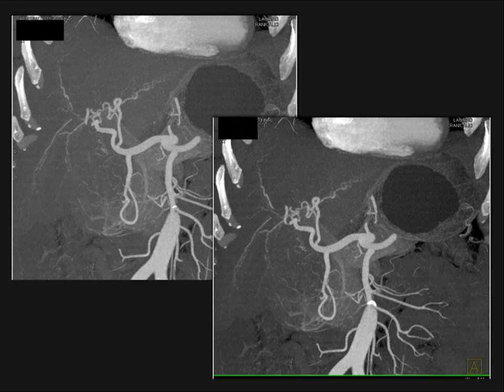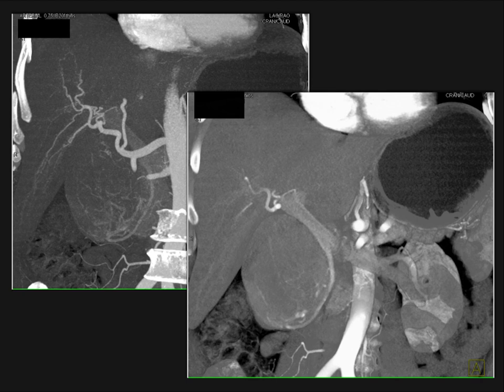And then you look at it a little bit closer, you say, well, it abuts the portal vein, but not invading the portal vein. And it abuts the SMV, but not invading the SMV. And we can see it's stretching the GDA and hepatic artery, but the vessels are widely patent. There's no SMA involvement. And you can see there is some neovascularity in the mass on the MIP imaging, but you can see the displacement of the patient's GDA. And you think about it, that's what it was.